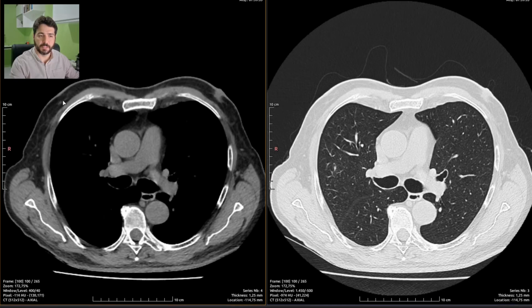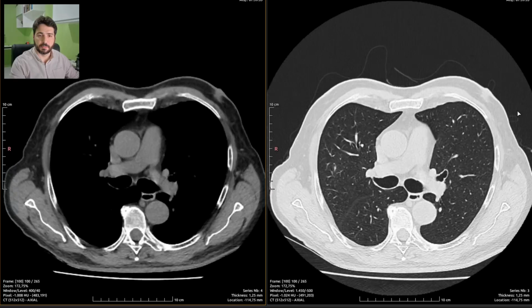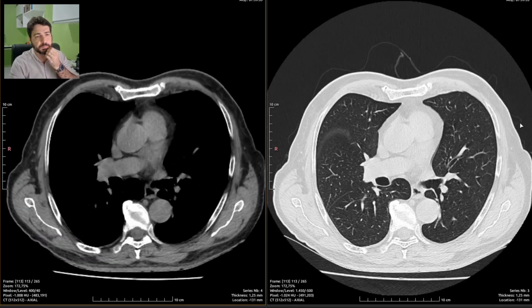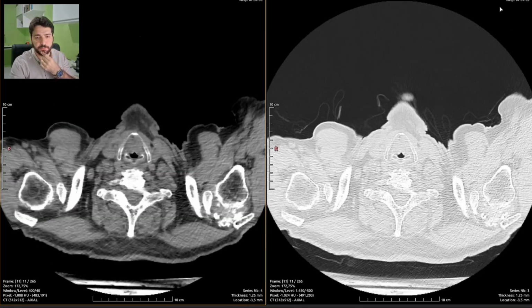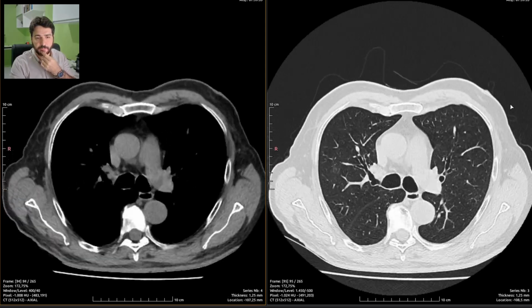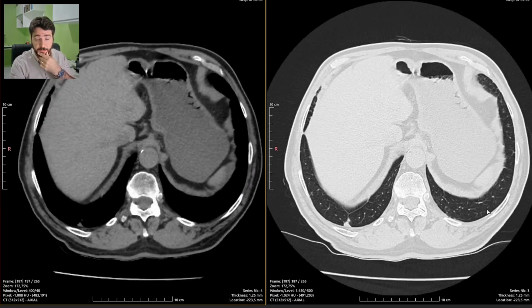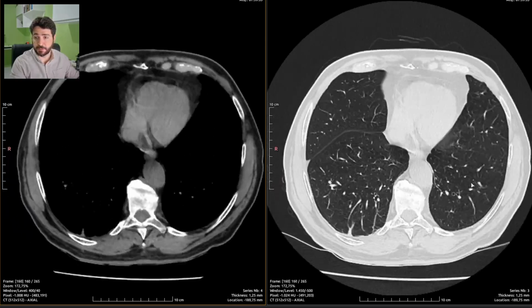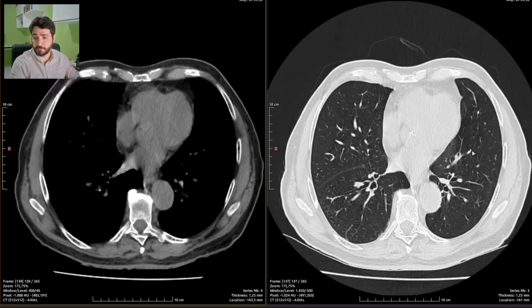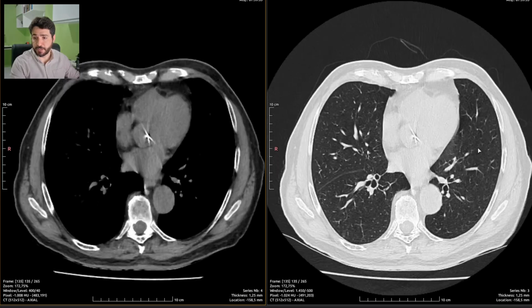We have a bit of gynecomastia right here, some breast tissue right below the nipples, which is very common in the elderly due to chronically reduced testosterone, and sometimes chronic obesity. This patient isn't obese, so that might be due to old age. Nothing major still.